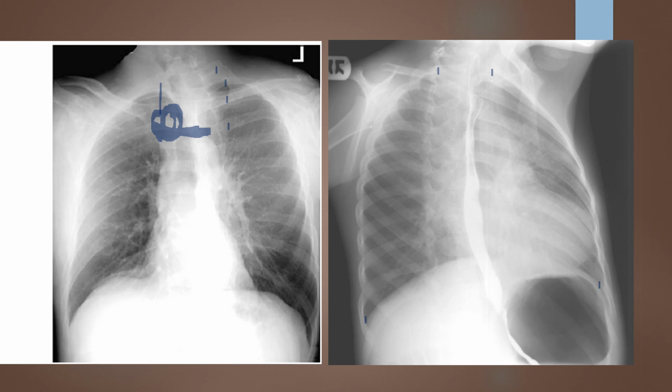Now I'm going to look at my mid-coronal rotation. Here I can find the lateral area of the vertebra, measure that distance over to the lateral area of the ribs, and that is going to be about twice the distance that I have on the opposite side. So 45 degrees looks like a pretty well positioned 45 degree oblique. Now I'm going to look for mid-coronal tilting. So my mid-coronal rotation is good at 45 degrees. That means my mid-sagittal rotation is good at 45 degrees.